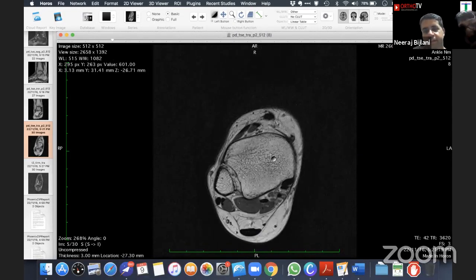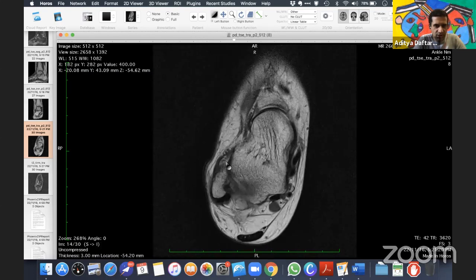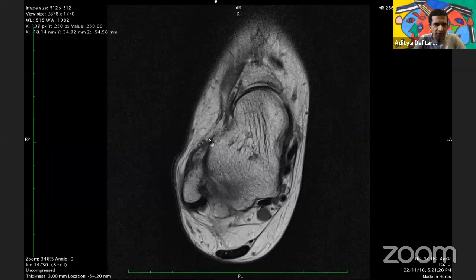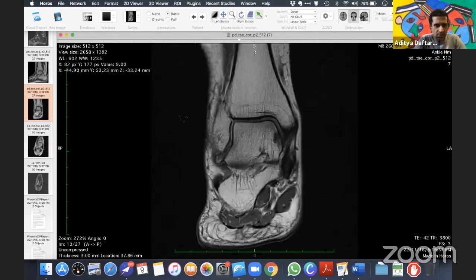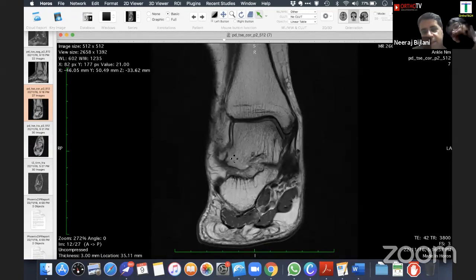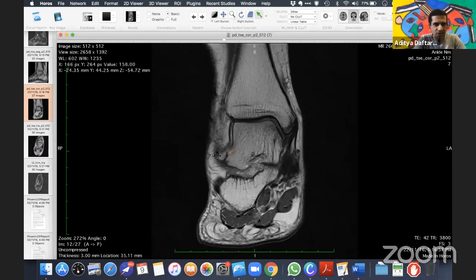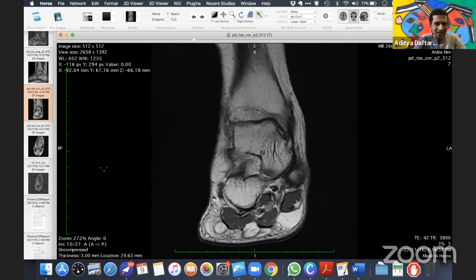Okay. All right. So first of all, when you come here, you have to be careful as you come down here. Could this be additional bone right over here? Okay, so you see this area here, this would be the ligament typically, but we just need to check to see if this could be bone. So we want to go onto these coronal images here, scroll back and forth. So you can see this come forward. Yes, this is a small little piece of bone in the back here. So this could be a small little bony avulsion that was there, which could be causing the impingement. So that is there for sure. So there has been an element of a bony avulsion.